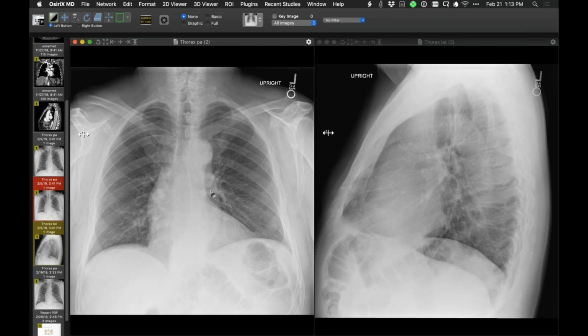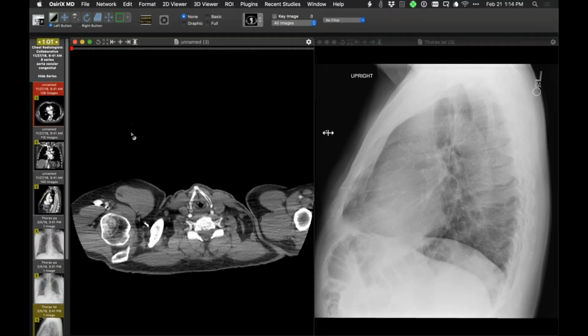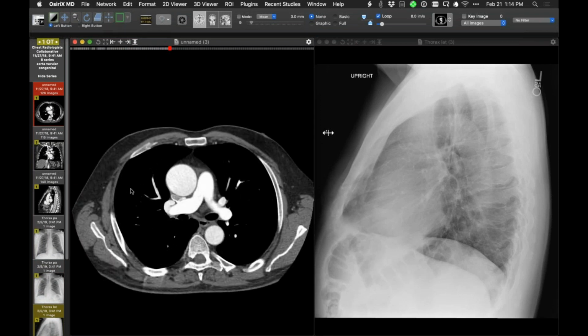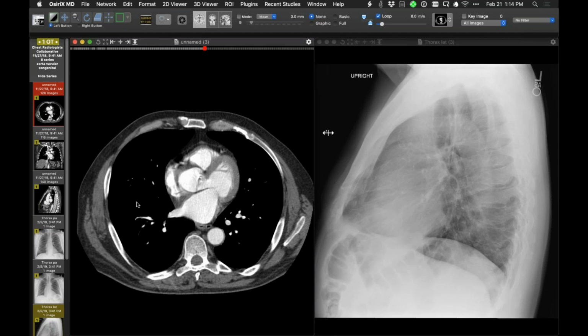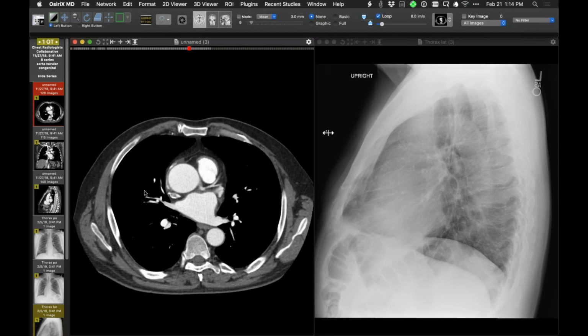So if you're confident that the aorta is dilated, then one should think of particularly a bicuspid aortopathy, a combination of a bicuspid valve and dilatation of the aorta. This person does not have an aortic coarctation, but does have a bicuspid valve. So depending on the valve fusion pattern, if you have a left-right fusion pattern, the jet of blood through the valve is directed more towards the lateral aspect of the ascending aorta.